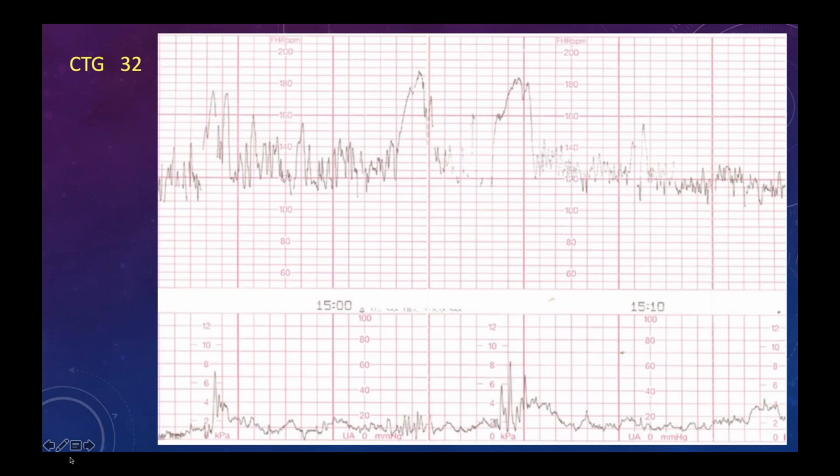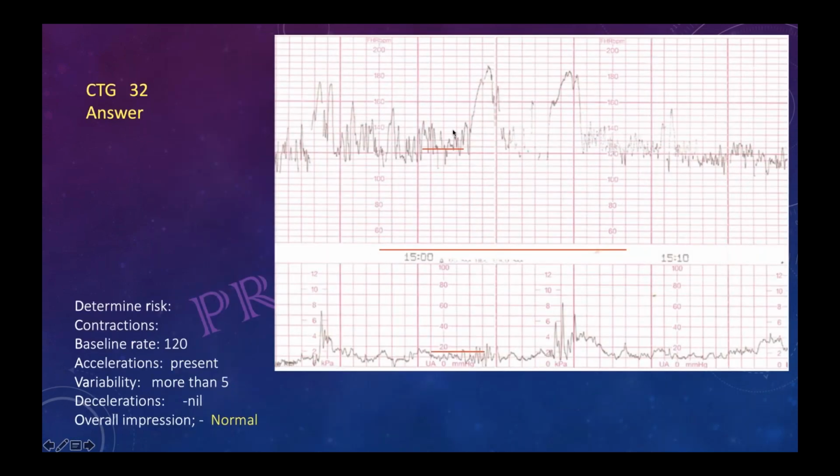If it is more than 25, it will be suspicious, isn't it? More than 25 for 15 to 25 minutes. That's less than 25. Yes, it's less than 25.